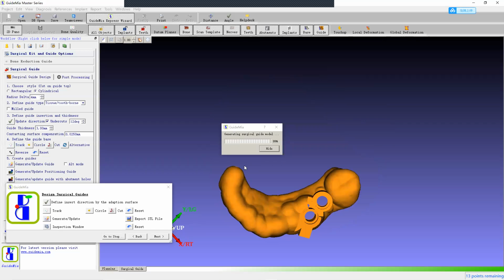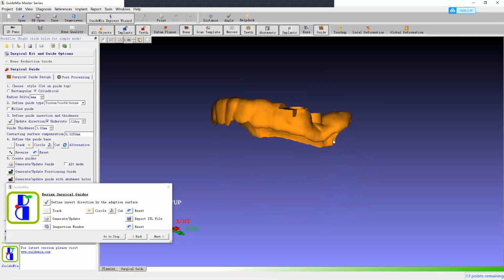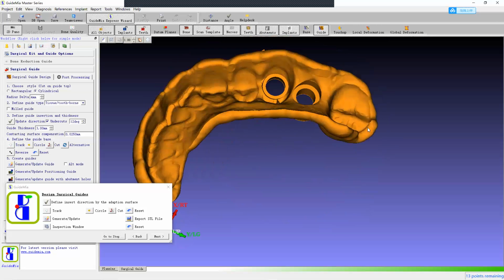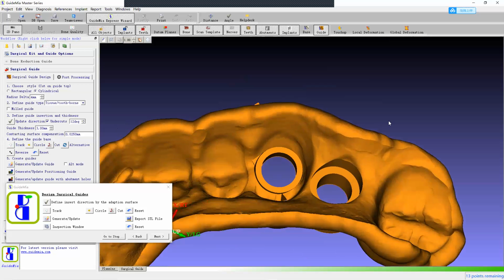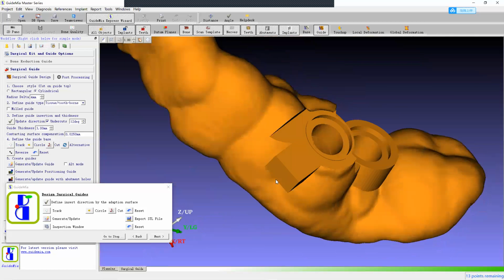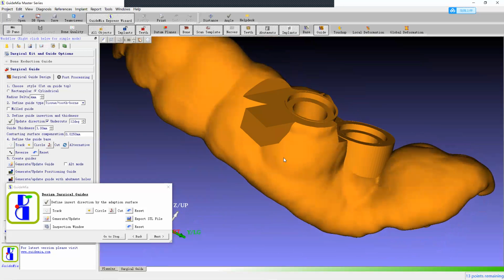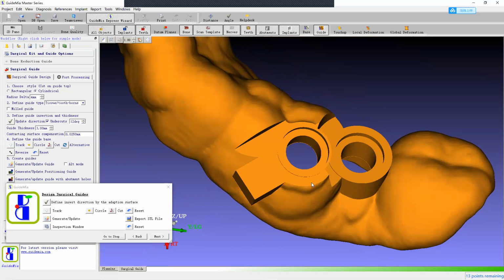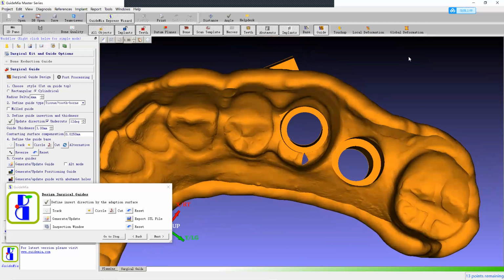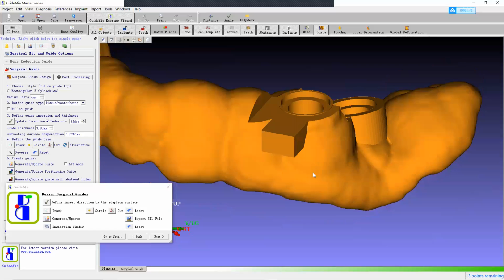Now I'll finish the guide. Remember I said I purposely made some mistake here. You see here, for the surgical guide, as we know, for immediate tooth extraction, this part initially has teeth, right? Then the guide will cover this area. After you cut, it's going to cut away, a big hole here, could be. And in order to fill the hole, we add this material.